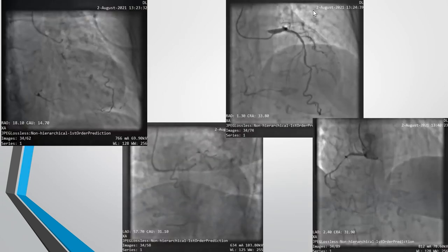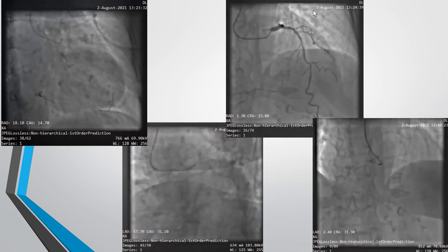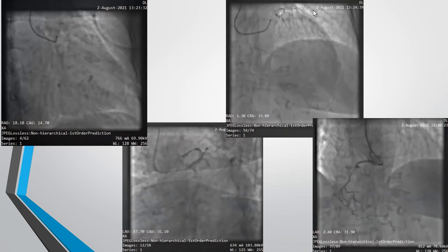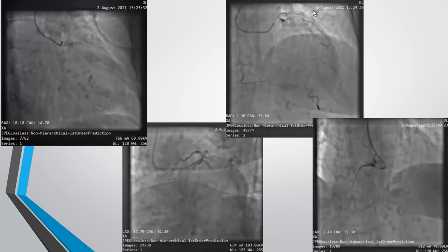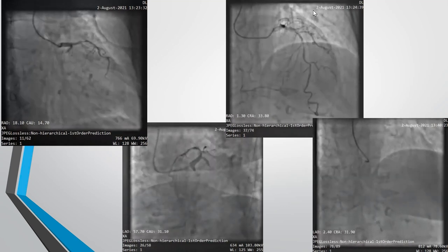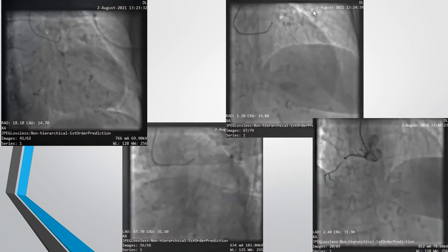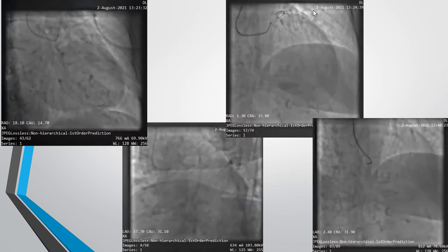This is the angiogram showing multivessel CAD. Circumflex was totally occluded proximally. LAD had severe calcification proximal to mid segment with severe lesion angiographically, which was also giving collaterals to the occluded RCA. And on the lower, you can see RCA had a severe proximal to mid lesion followed by total occlusion.